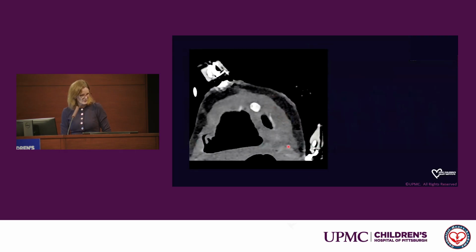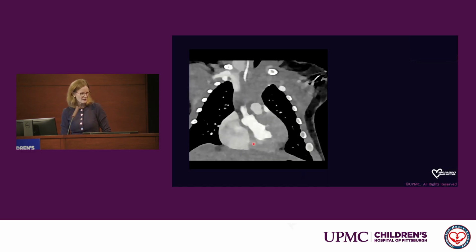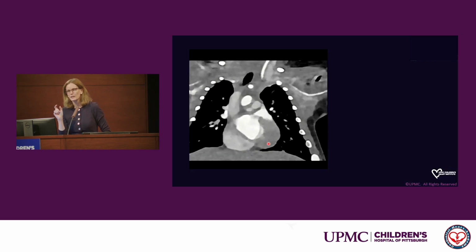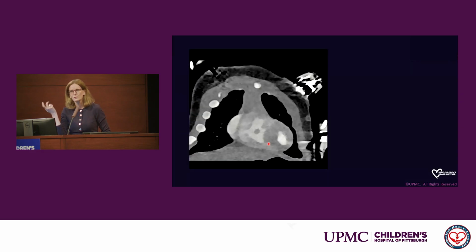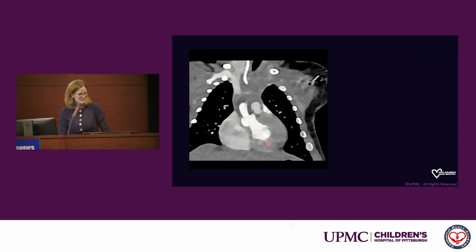This child underwent a CT to further look at the dimensions of the thoracic aorta, as well as look at the coronary artery origins. So I'm going to show this to you in the coronal view. Because this is a baby, sometimes we gate imaging at above certain heart rates. We actually gate the imaging not in diastole, but in systole, because the more still part of the cardiac cycle is theoretically in systole beyond a certain heart rate.